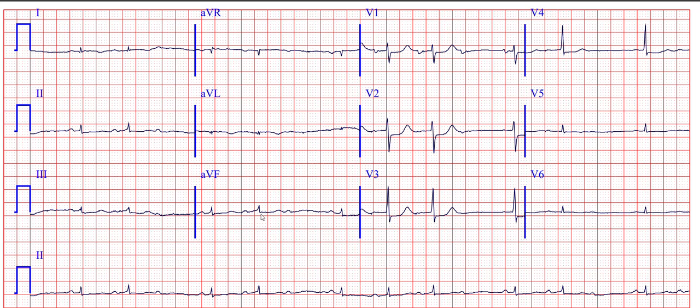So can it be myocardial infarction given the ST depression in V1, V2, V3? Definitely, it can be posterior wall infarction, because in posterior wall infarction you will see depression in the right precordial leads. So there is ST depression and you can see there is a conduction problem.